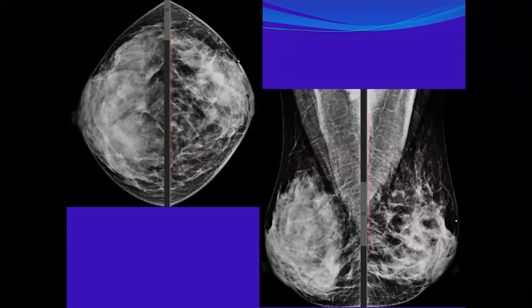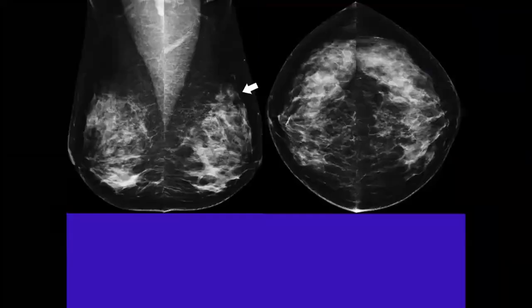Okay, thank you very much, Sarah. Well done. Okay. Thank you. Okay. Any other volunteer taking this case? Quickly. There is an arrow. You have an arrow.